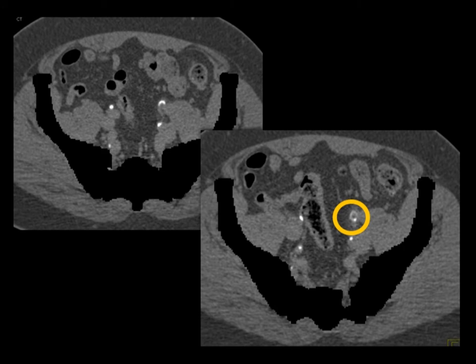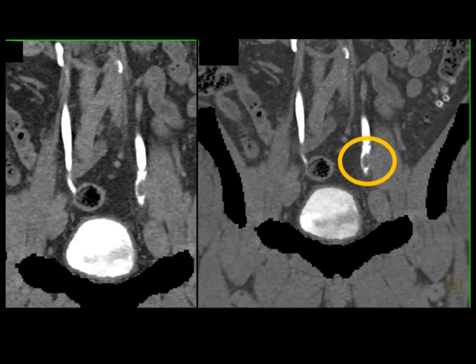And if you look really hard, looking at the left ureter, it's not dilated. Now, I was doing bone removal, and if you look very carefully, you can see this small little crescent sign. And if I just stop perfectly, there's a ring sign or donut sign. That's very subtle, but look what happens on coronal view.